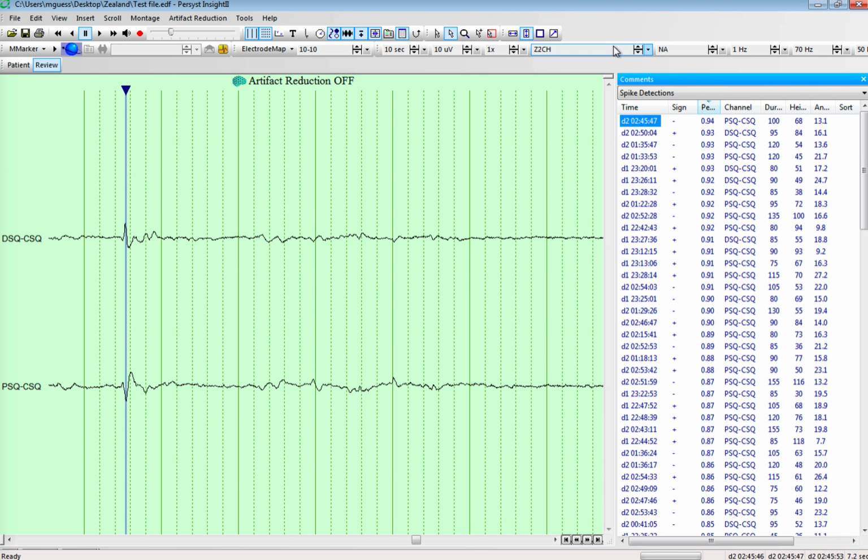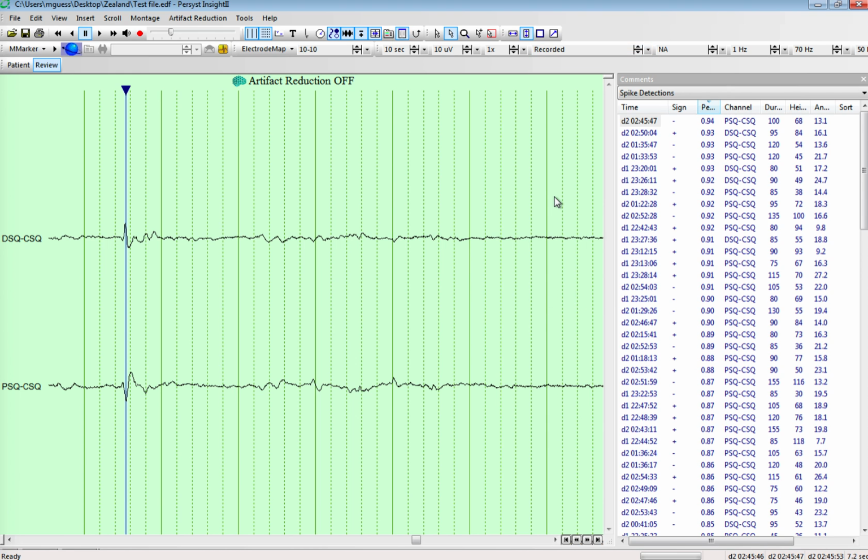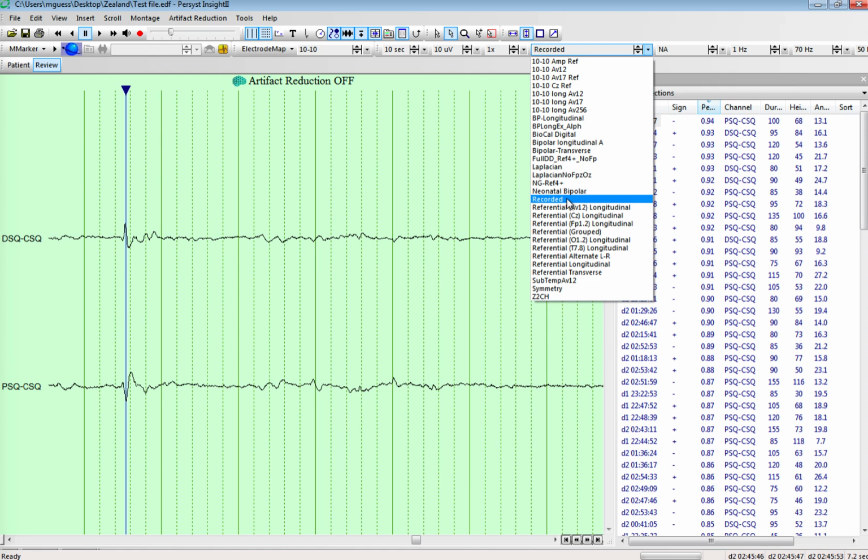So how did we get there? First of all, I created a montage that had just the two channels of interest. I'll go ahead and select the recorded montage. By default, you may pull up the program, open up a recording, and it's going to show a bipolar longitudinal montage. There are no 10-20 channels in this recording, and so going to the recorded montage, regardless, will always show you the raw recording, which is in this case the DSQ and the PSQ channels to the common reference.